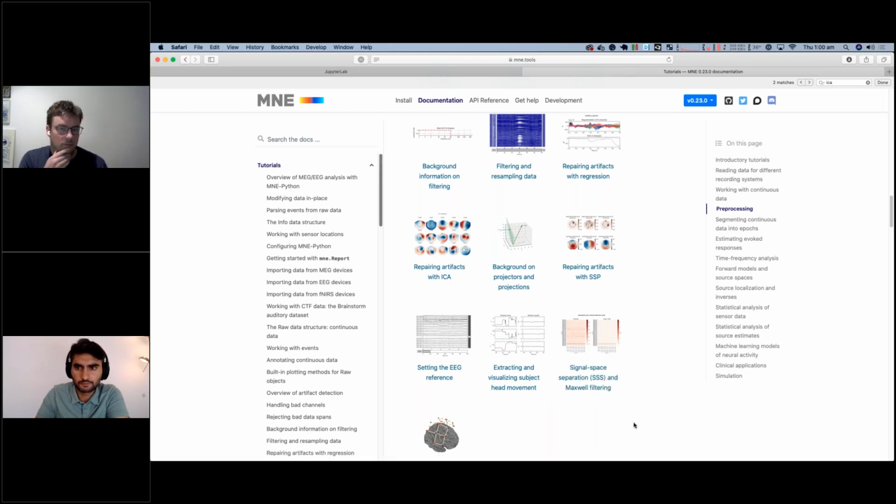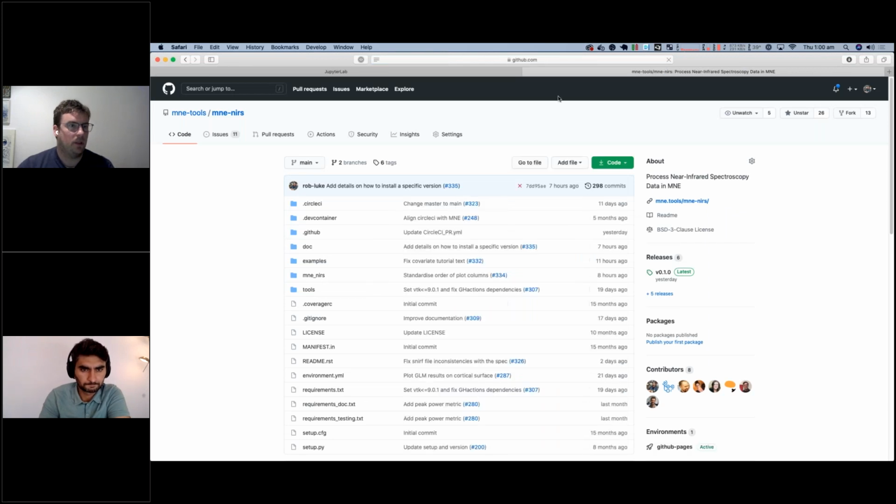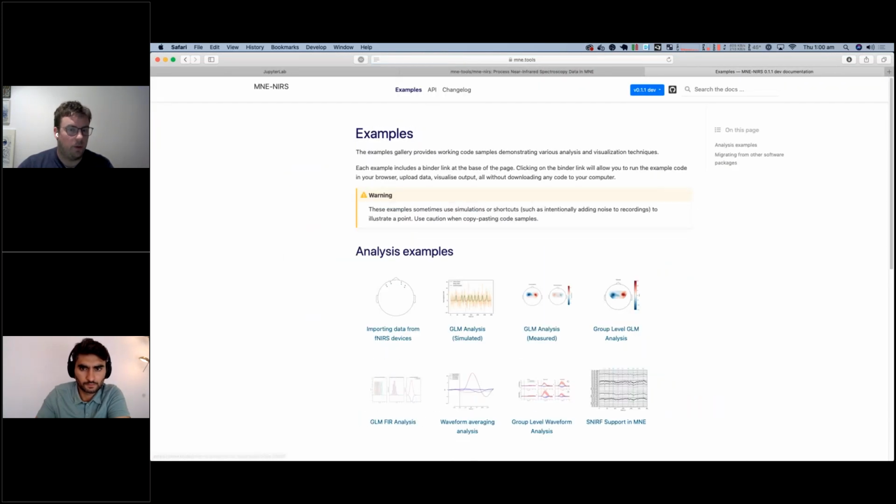You mentioned this last time, but if you could give us a quick overview of the signal quality assessment tools. Oh, yep. That information would be on the MNE NIRS website. So if you go under the examples here, we can go through one of these.